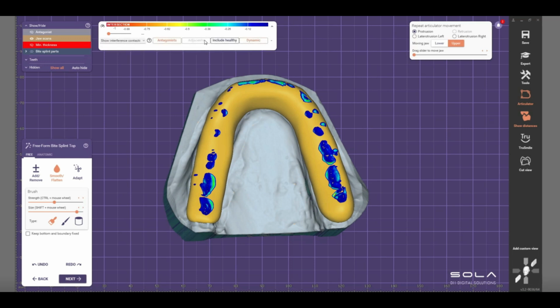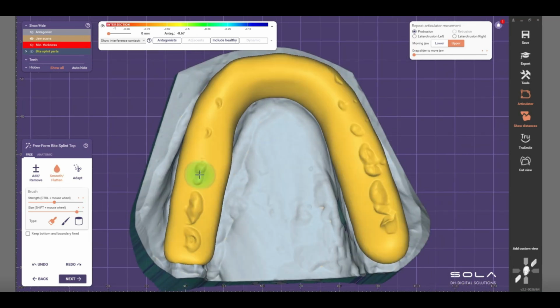I would take away the color, but to take away that color, the blue one, you click on the antagonist, it takes away that color, and it will smooth it, only smooth it, not with a shift, just with the smoothing, just to make sure they are rounded and smoothed out. So the marks remain, but they're smoothed out.